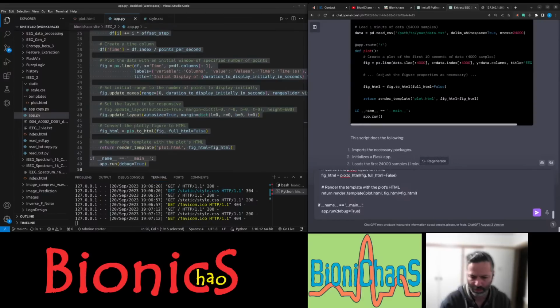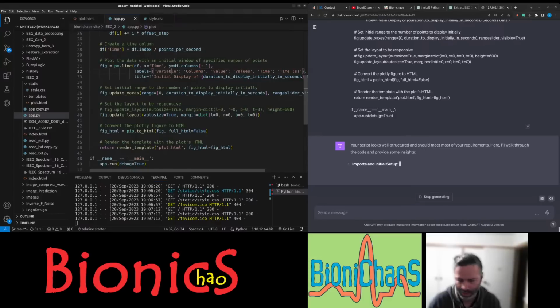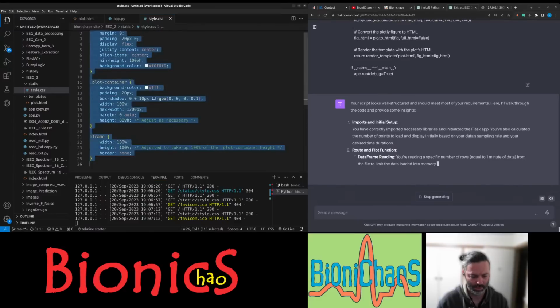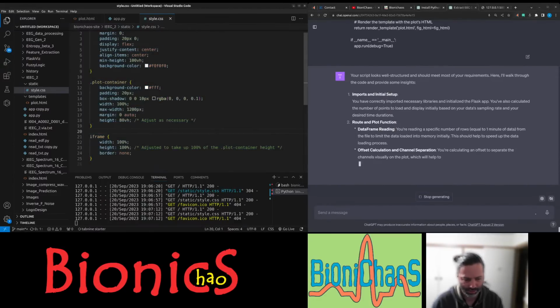It keeps forgetting the code. You have to keep reminding it. It must have the CSS because it just generated it.